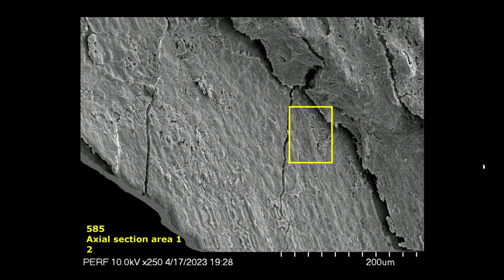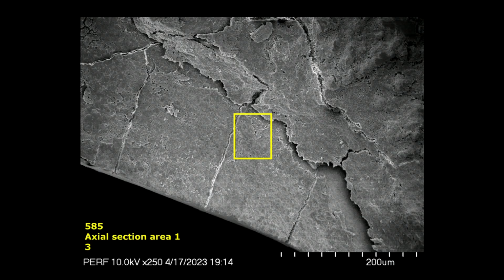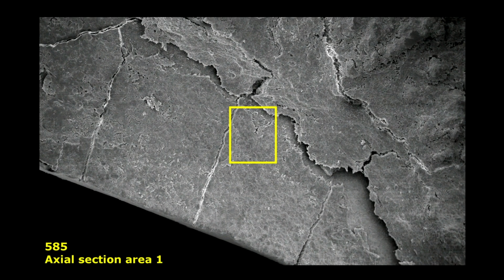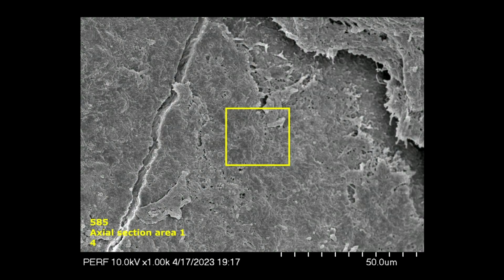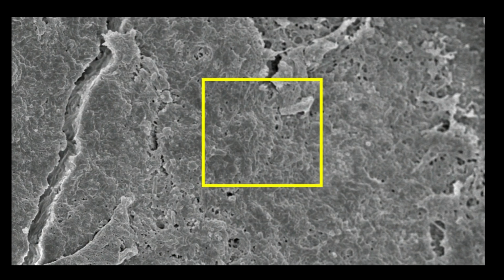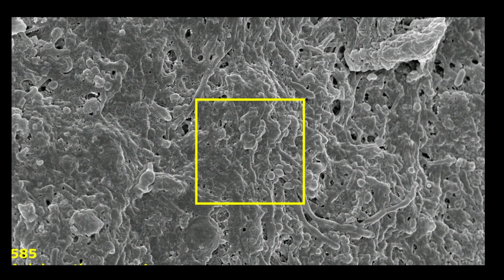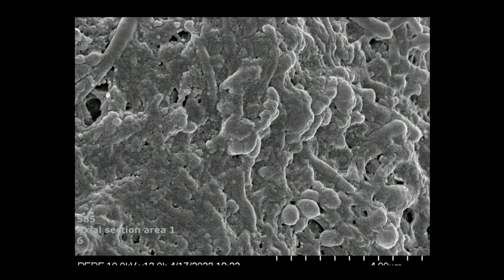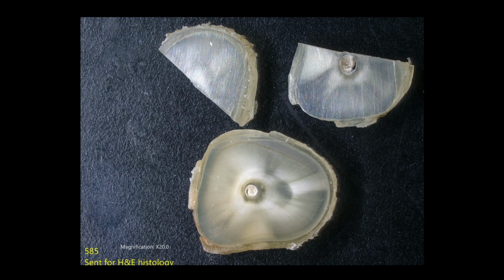But pretty much everywhere we looked on the dentinal surface and on the cemental surface, there was a very, very robust biofilm, sometimes easily identifiable and other times completely embedded in EPS. There you can make out the individual forms, but there's a lot of EPS there as well. So I hope this helps you in your pattern recognition of learning how to identify biofilms.